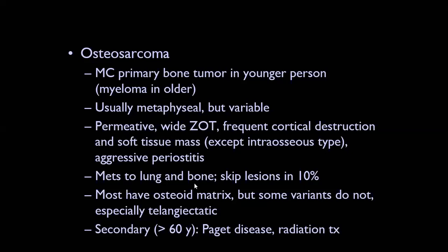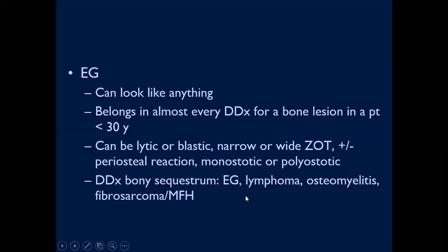Here you have these skip lesions, which are important in MCQ. When you find them, you will search for them. And maybe also to be mentioned that the osteosarcoma metastasis in the lung is much characterized by pneumothorax. Okay, so these are the MCQ questions.